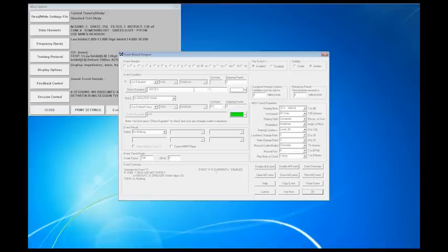Net offset, I think, is just nothing. Yeah, that's just 100 minus duty. Yep, and that's just that. And pardon me, I always have to go through this and figure out where we have these, because we wanted to make this all nice and neat for everyone.